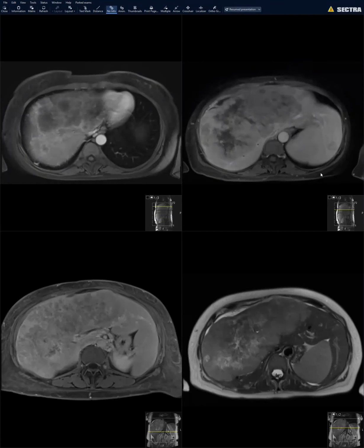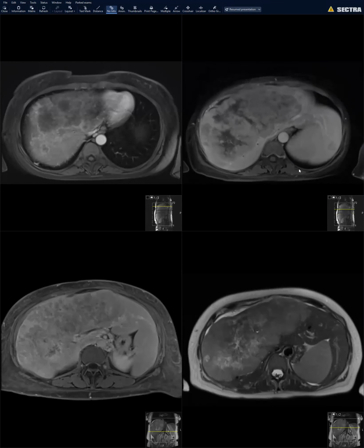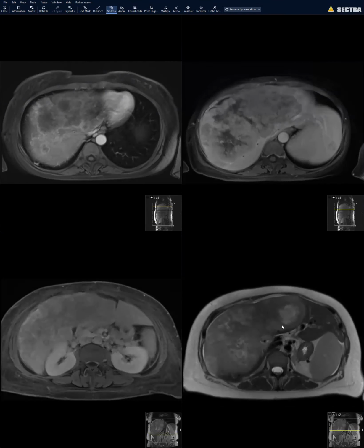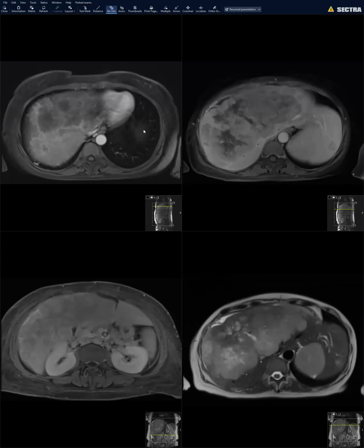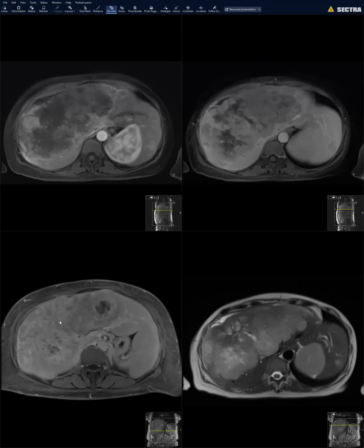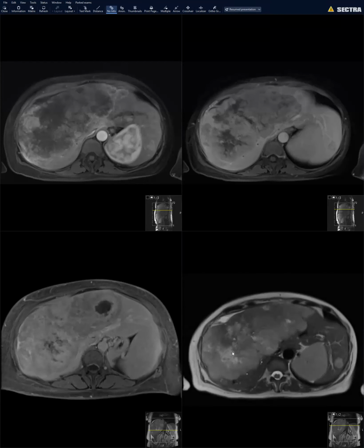So that's arterial, obviously multifocal, involving a lot of the liver. Liver's big also, and there's even a lesion in this elongated left lobe. Looks like the intermediate grade tumor signal we see on T2s. Some other ancillary findings we noted: from the arterial phase to the more delayed phases, there was almost a component of filling in the tumor. There was definitely some capsular retraction.